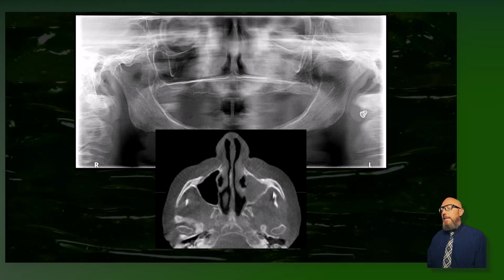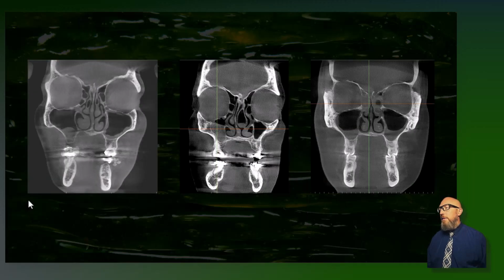And here we have an axial slice of the CT, and you can see it in greater detail. Now we can appreciate that posterior lateral border is kind of sclerotic. So instead of having that nice, thin, well-defined corticated line, that sclerotic border is what's led to it appearing missing here. So this could just be a chronic sinusitis. Either way, I'd still feel more comfortable referring this patient to get evaluated because of the possibility of transforming into something more detrimental.